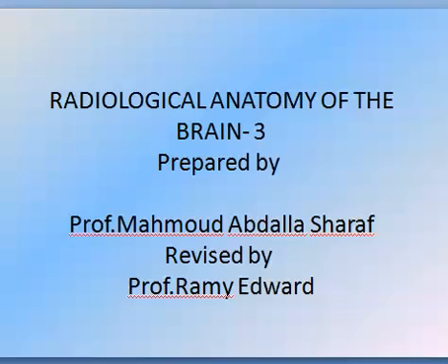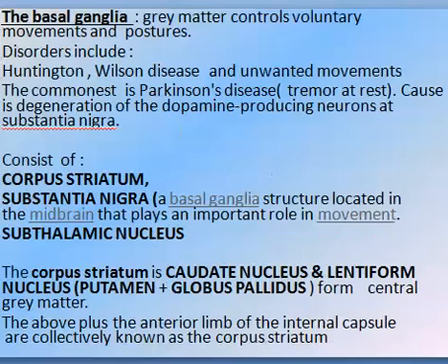Third presentation about radiological anatomy of the brain by Professor Sharaf and revised by Professor Rami Edward, will be concerned with basal ganglia and the internal capsule. The basal ganglia are a group of gray matter nuclei responsible for integration of movement.